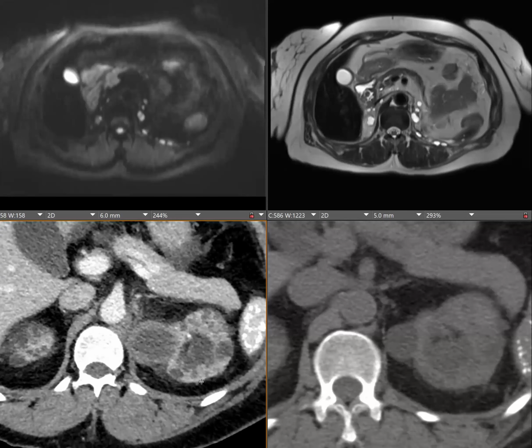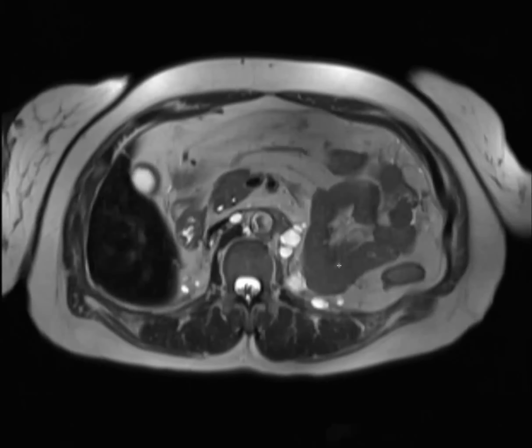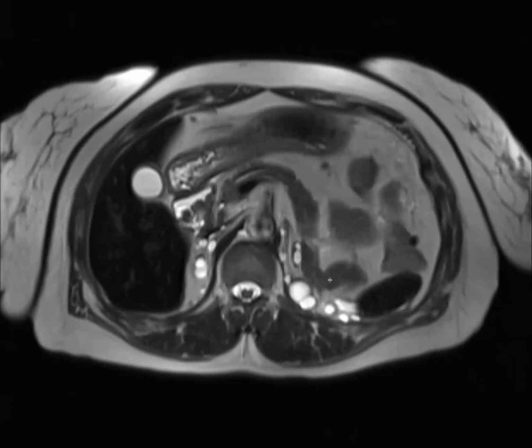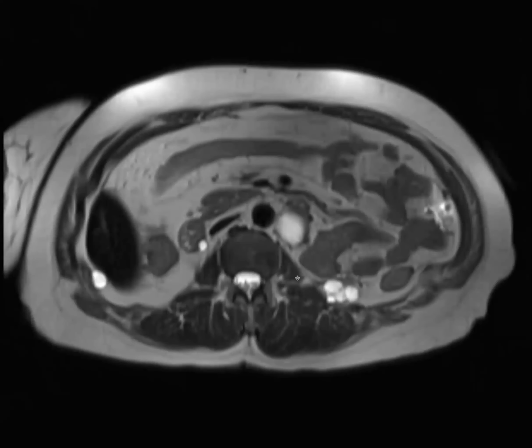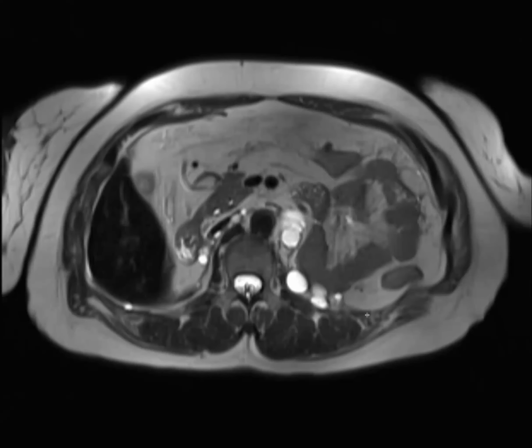For cystic renal cell carcinomas, we usually think about them as being indolent. Very, very rarely do they metastasize, and it's usually the solid components, not the cystic part, but the bigger the solid components, the more the risk increases. And the metastasis post-op is all cystic. It's just a really bizarre presentation, and I think that's because the subtype is completely different. Yeah, I think so, because it was confusing why she had it. We were first thinking maybe a lymphangioma kind of presentation, but then the cysts were resected and biopsy proven.